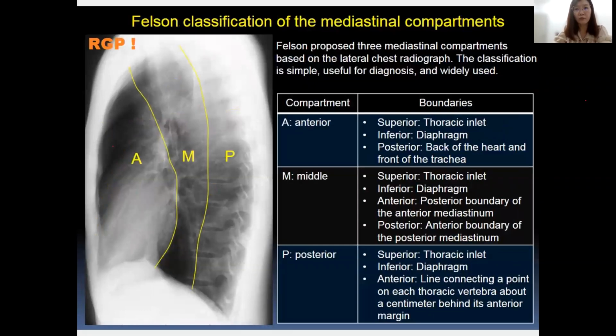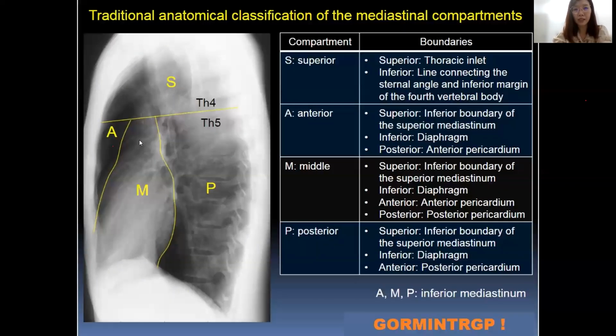All right, so from the lateral view, these are the Felson classification, so we just use anterior, middle or posterior. Okay, but still I like to use anterior, middle, or posterior mediastinum to differentiate on the lateral view.